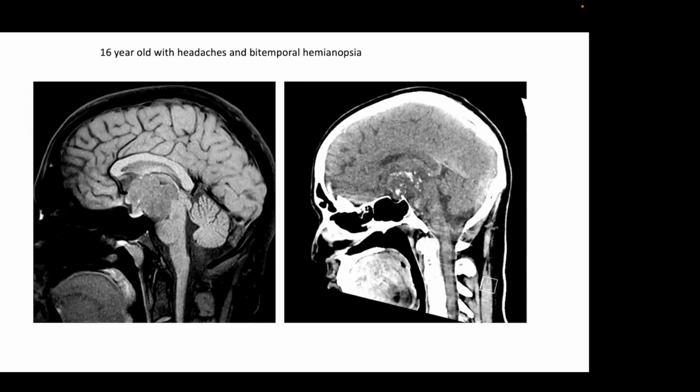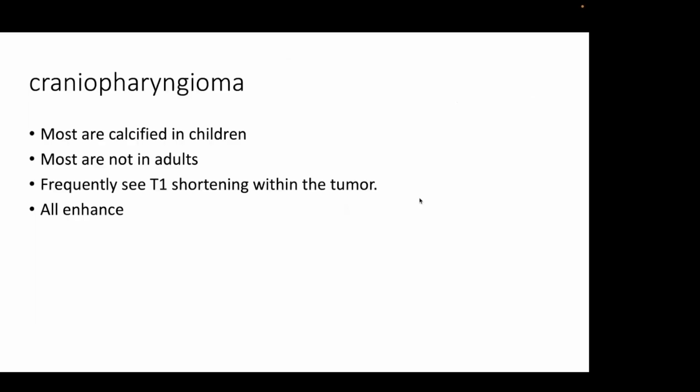Yes, very good. So your first inclination was exactly right. This is a craniopharyngioma. Typical appearance, young patient, suprasellar mass with these calcifications, very commonly seen with craniopharyngiomas. And so that is the diagnosis.